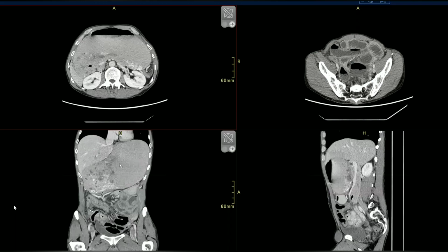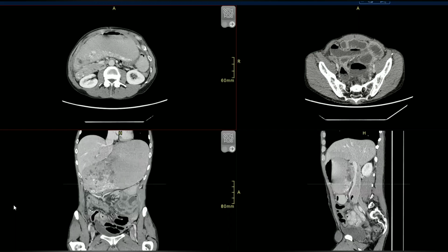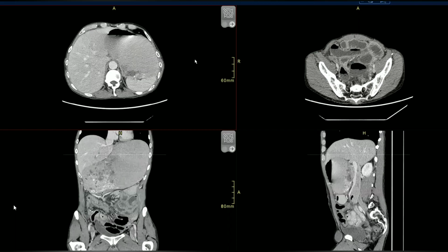In your description, what I would have liked is, since it's distended, you'd have said something about ischemia. Whenever you see bowel, you must look for ischemia, always, because that is one cause that you need to exclude every time. So there is nothing like emphysema in the stomach. The only thing is that it's distended, right? Where is the transition point, which is the second point? Whenever you see bowel obstruction, small bowel, stomach, wherever, you have to look for a transition point. Where is that?